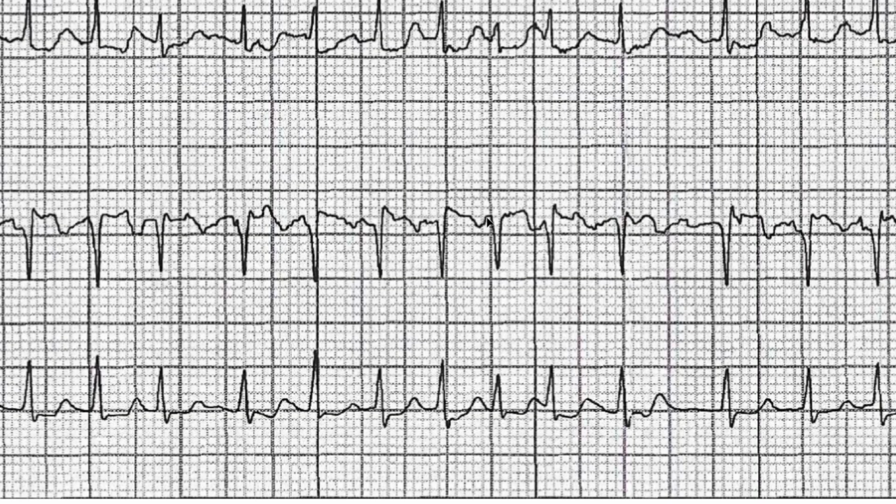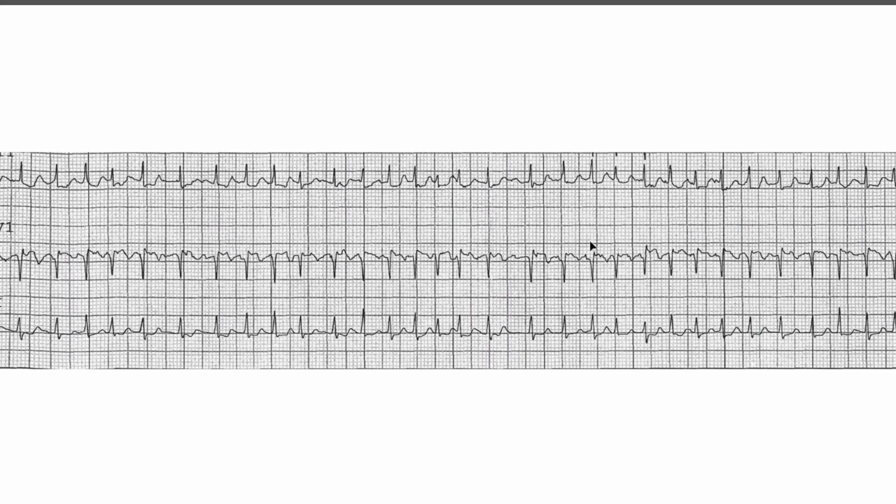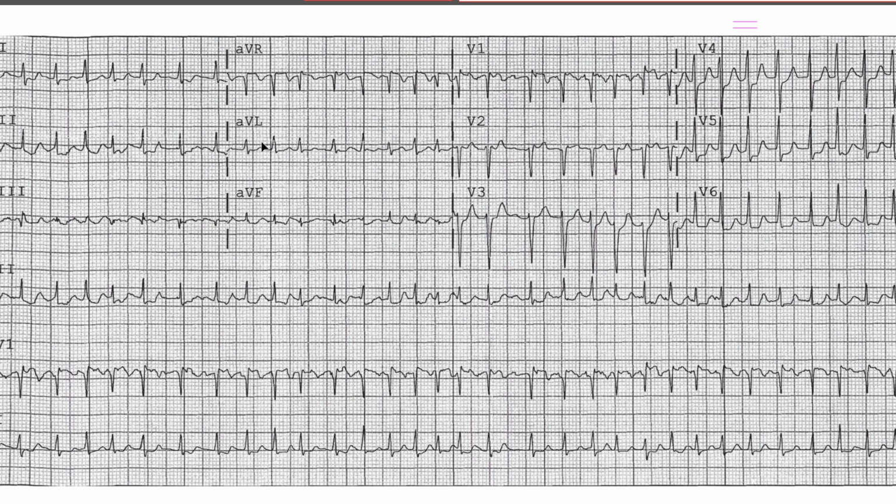You know, is this an ectopic P wave? Is this a regular P wave? What is going on here? But there's definitely something present in front of every QRS. Now, is this just a culmination of the wavy baseline, and every so often you get a bigger depolarization, be it positive or negative? I'm not sure at the moment. So far, I'm still stuck on atrial fibrillation. So I'm going to move on to the 12 lead. I want to see what the 12 lead says.